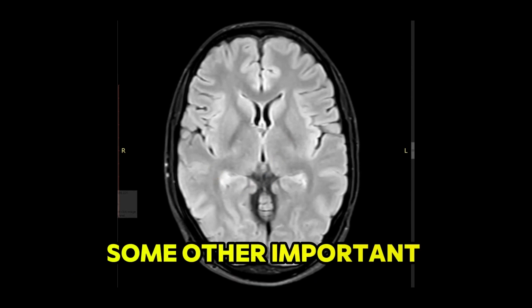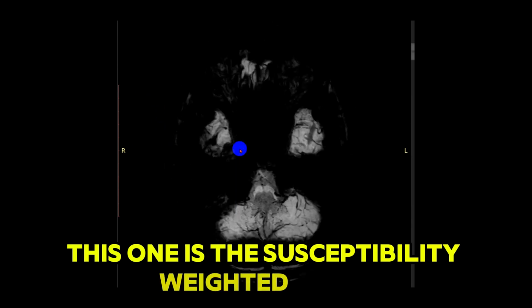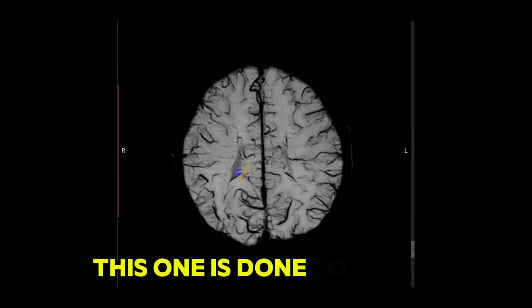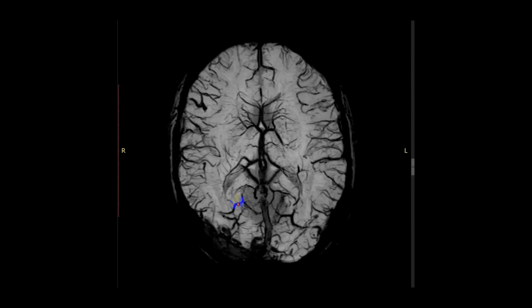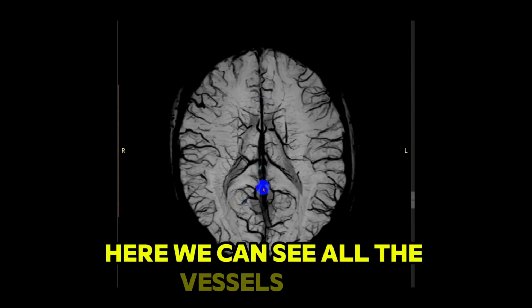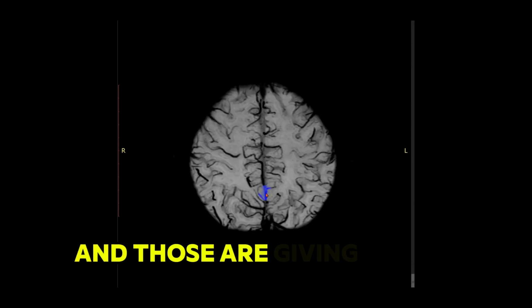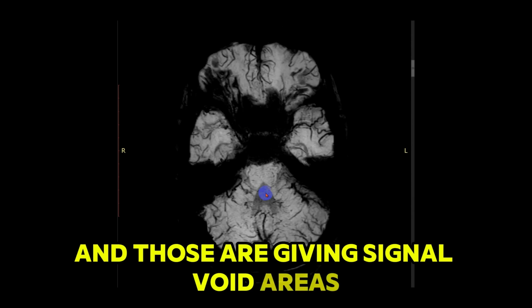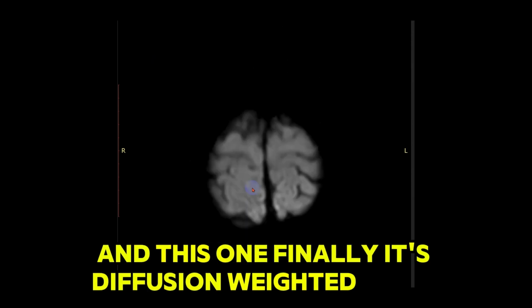Some other important sequences are, this one is the susceptibility weighted image. This one is done to assess whether there is any hemorrhage or calcification. Here we can see all the vessels, and those vessels are containing blood and giving signal void areas. And this one, finally, is the diffusion-weighted image.